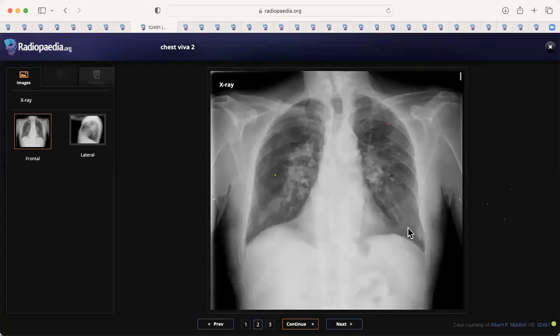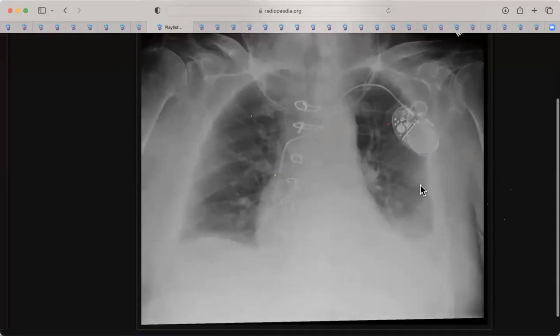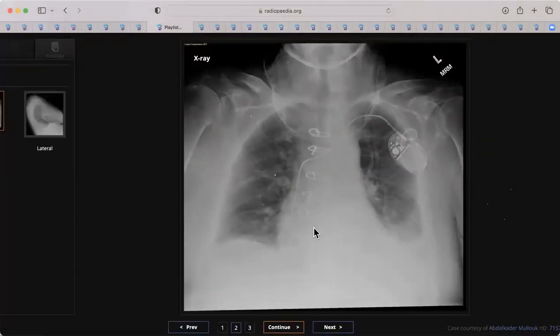We said scattered calcification makes it more of silicosis, sarcoid gives bilateral symmetrical, and TB gives unilateral lymphadenopathy. That was a case of a simple pleural effusion, which is a parapneumonic pleural effusion. Whenever you see a pleural effusion, try and dig and look for the cause on the X-ray. It could be cardiac, or it could be an infective cause, which is parapneumonic effusion.